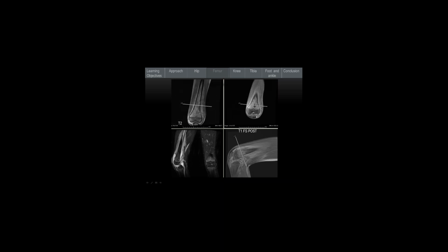When we gave contrast, the most important finding was that most of the femur was enhancing. However, there was a focal area, a spot within the distal femur that wasn't enhancing. This is osteomyelitis developing a Brodie abscess. So again, infection can occur and start within the joint, but it can also occur within any long bone as well, separate from a joint. It's important for us to detect osteomyelitis because typically these children will get intravenous antibiotics for quite some time if they're capable of getting that treatment.